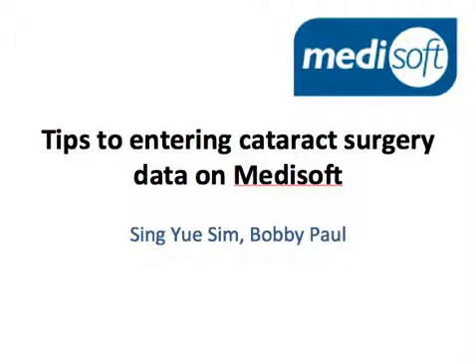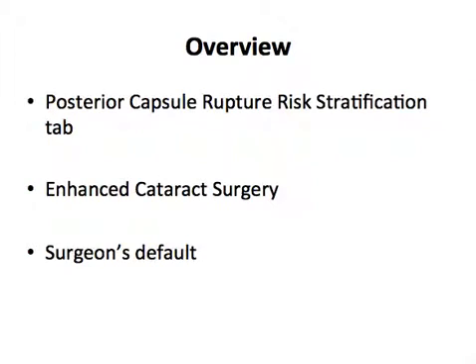Hi everyone, in this second video, I'll be sharing with you some important points on entering cataract surgery data on Medisoft. We'll be focusing on three important points, namely posterior capsule rupture risk stratification, enhanced cataract surgery data input, and finally how to set individual surgeons' defaults.